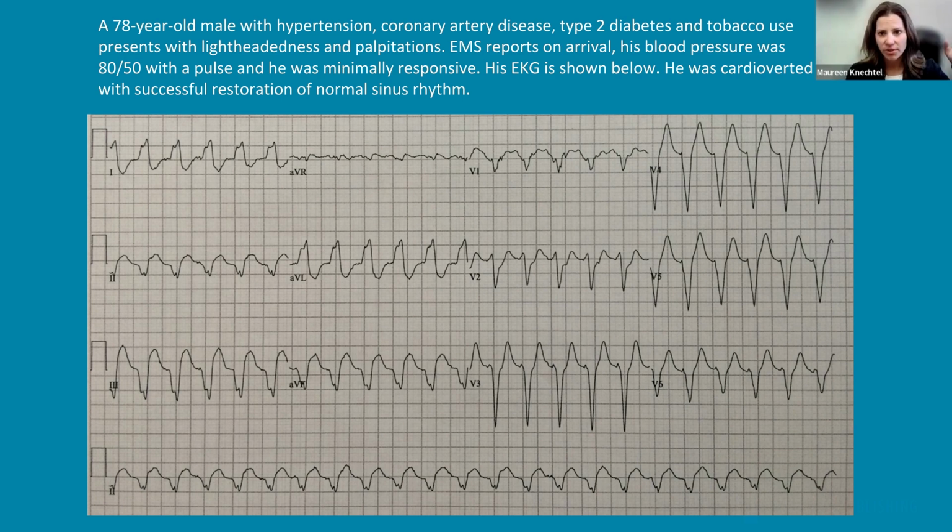We've got sinus node, life is good if you're a P wave, you just keep firing away no matter what. But then there's some type of irritability in the ventricles. Why does VT happen when it's related to a patient with coronary disease? There's some type of scar tissue, whether there's active ischemia or an old MI. As electricity spreads down through the ventricle, it weaves slowly through that abnormal tissue, and in doing that, it can essentially circuit. And now we have a VT focus that comes around that abnormal heart muscle. And so we should see evidence of AV dissociation.